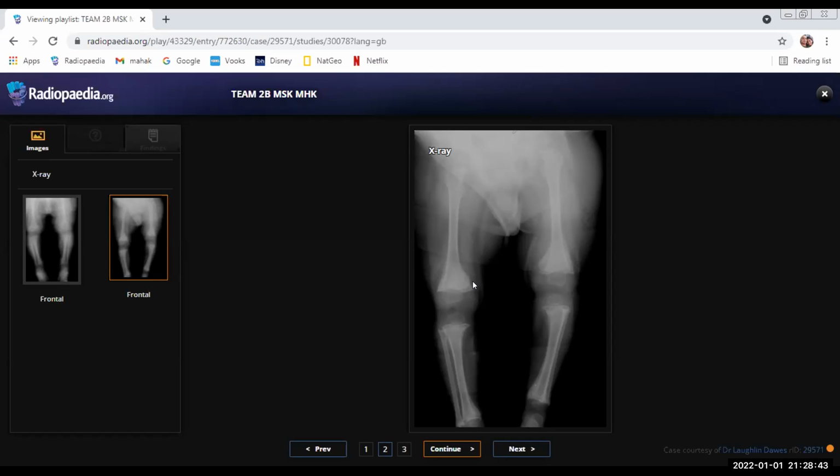Okay, what would be your other differentials? In a child, I would also be thinking about rickets. But in that case, I wouldn't be seeing this pencil thin epiphysis. Coming to think of it, maybe the other differential would be rickets. I'm not really sure at the moment. Initially, because of the epiphysis, I thought that this is scurvy, but because of the metaphyseal flaring and widening, this could be rickets as well. And in that case, I would ask for the vitamin D levels.